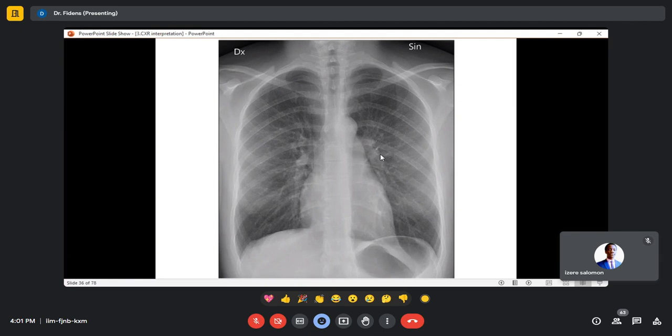What I can tell you is about the hilum. Can you see this concavity? It's concave laterally. Even this one is concave laterally. When you lose this shape, think of something abnormal. When you are looking at the hilum, always check this concavity. And check here, see how the pulmonary vessels are smooth and obliquely oriented, but peripherally you can't see them. On one side of the periphery, you cannot see the vessels. Look, you don't see them.